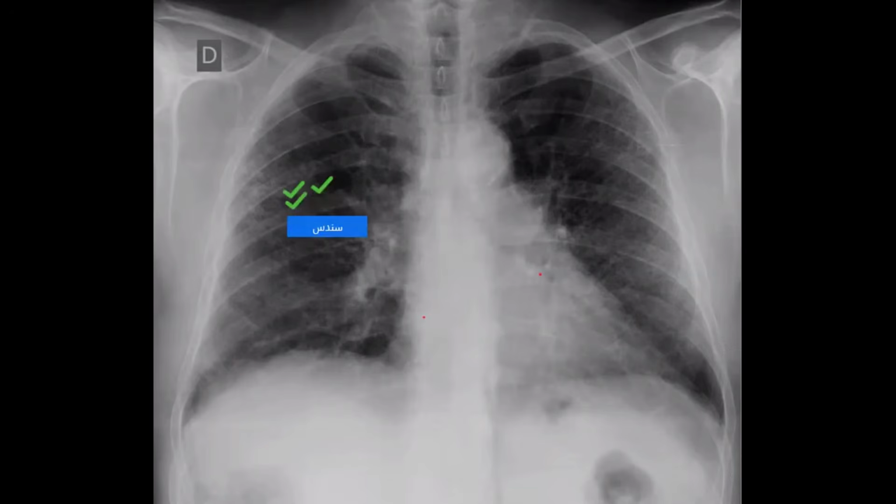So this is an X-ray chest frontal projection of an adult patient. I can see that there is ground glass haze with cystic areas seen in both lung fields, predominantly in the peripheral and basal distribution.